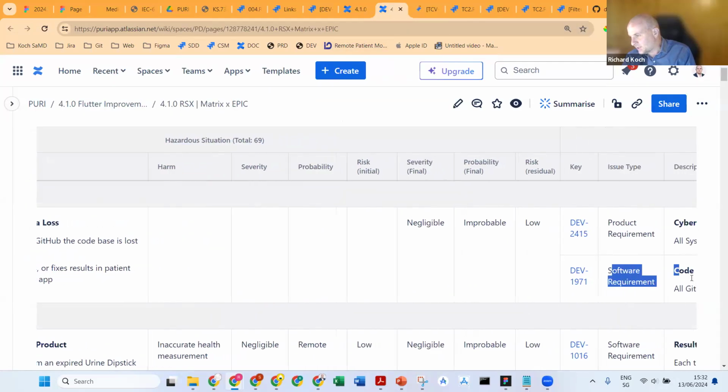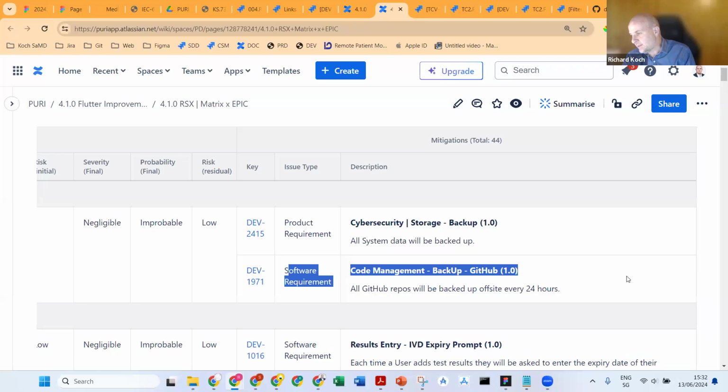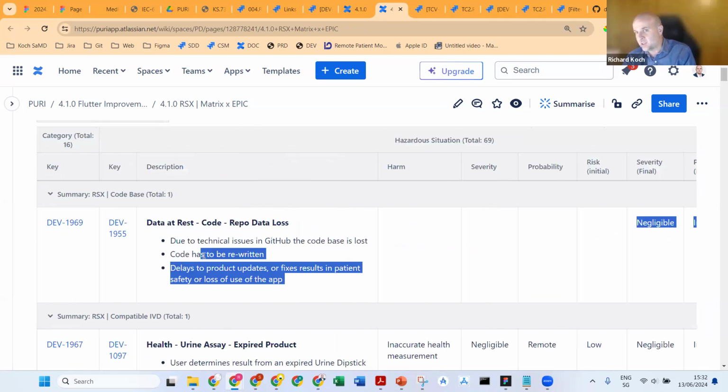and then you've got the mitigating actions, and you can add whatever fields you want to add. And again, as I said before, for reporting, you may want to do the full risk matrix. But if it's just for certain stages for reviews or interim, you may want to show things in a useful way. So you can see here, this doesn't fit on this screen. This is just sharing my laptop screen. But if you've got a big meeting screen, it can be better. But you've got the flexibility here to link and review and work collaboratively, which is obviously the key advantage of these tools.